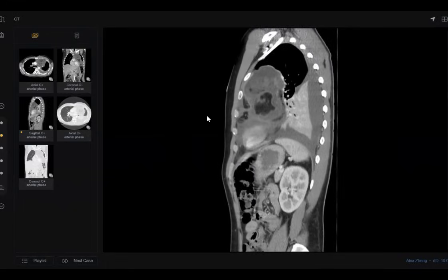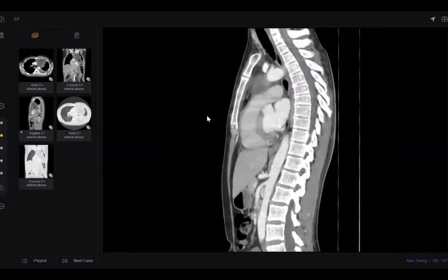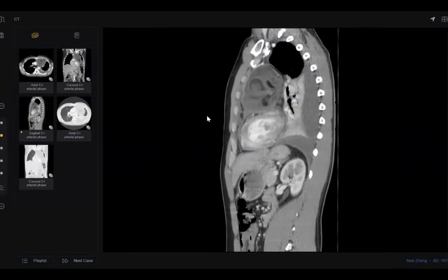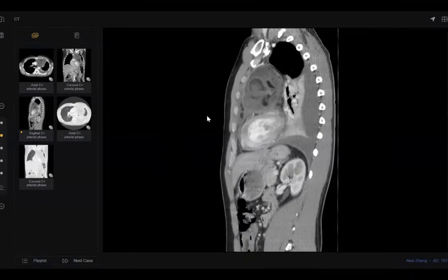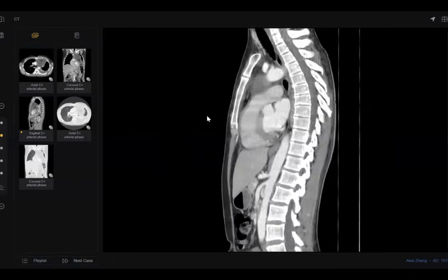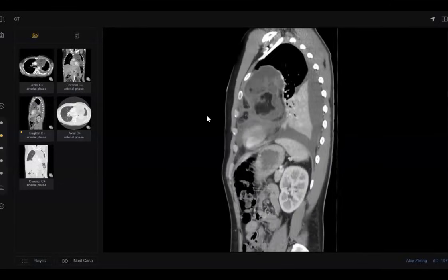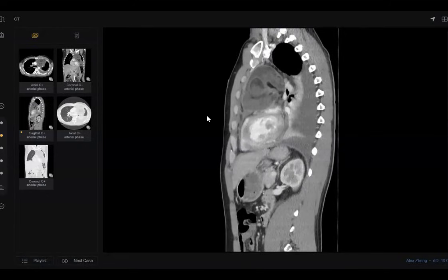Doctor, do you know the different types of teratoma? Sir, I know that there is a mature teratoma and an immature teratoma. In mature teratoma, we get this typical picture, a well-encapsulated, benign-looking mass. There is another, third type. Sir, I don't know of the third type. There are three types: benign or mature, intermediate, and malignant or immature.